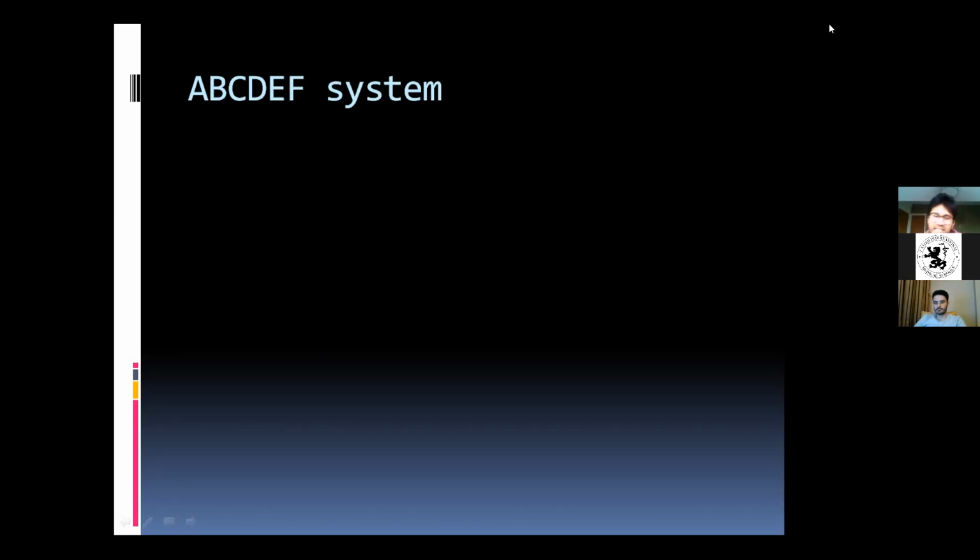On a CT, yes, we can, but not on x-rays. But before we do all of that, we have to make sure whether the chest x-ray itself is valid and of good quality. I mentioned validity and quality last time as well.